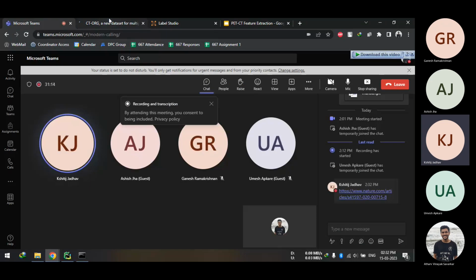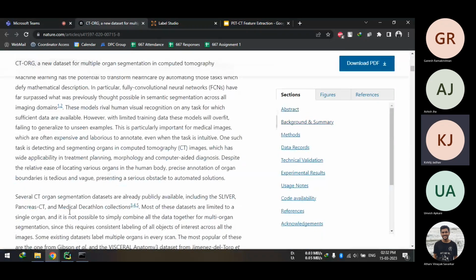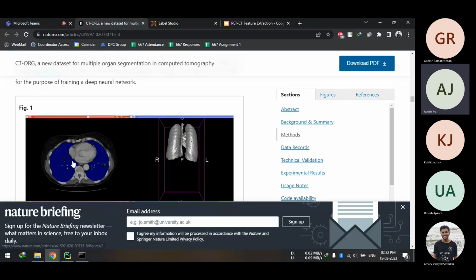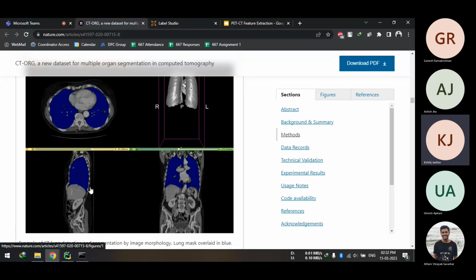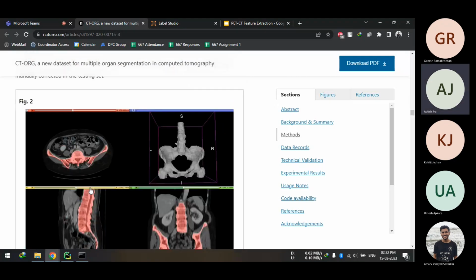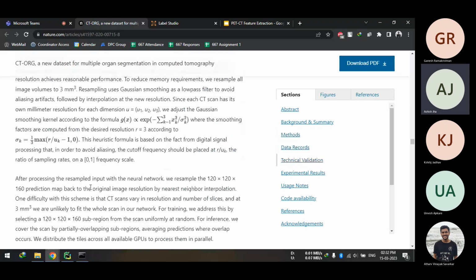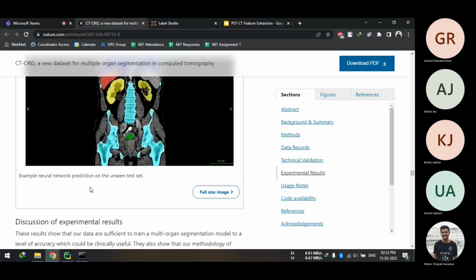Atharva, can you open what I have just sent you from the group? This one, yes, correct. And if you could go down. Yeah, okay, this is lungs. You see, it is much better than what we are trying to do. I think nowadays this is very much possible. Now we even have TPS systems which work on AI algorithms, auto detection.